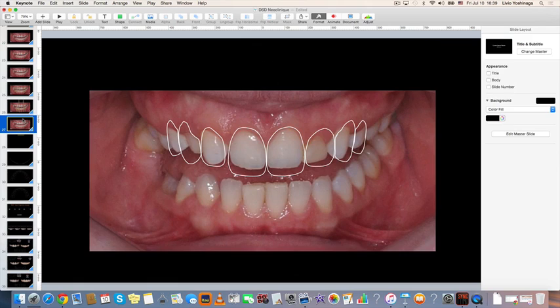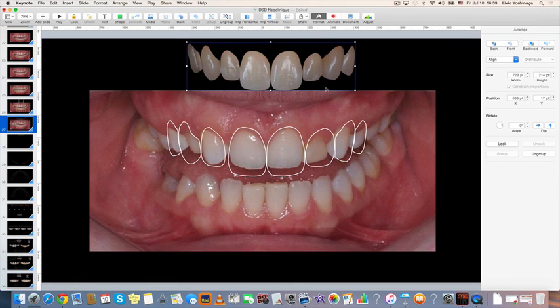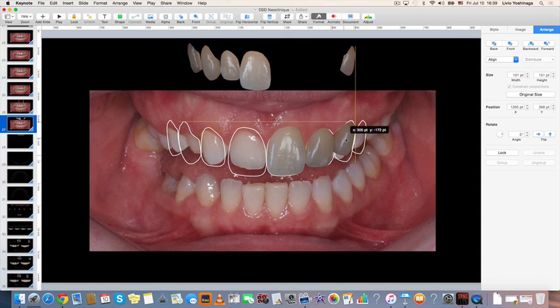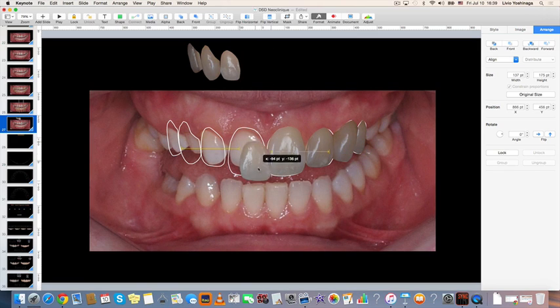So let's take those original colors, bring it back here, ungroup, and this is not a perfect science, but we're going to try to cover the white lines, having the white lines as a guide, and then I can reposition my teeth here, so I can simulate for Raquel the new smile. So you can see as it's colored, because of the light reflection, it gives me a very nice sensation of real teeth. So it's a little bit dark. We're going to take care of this in a moment.